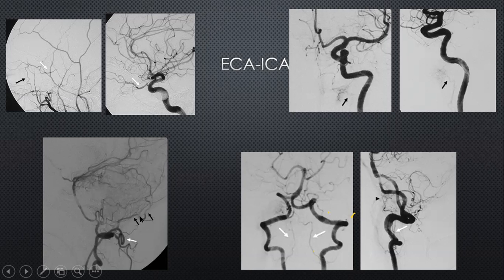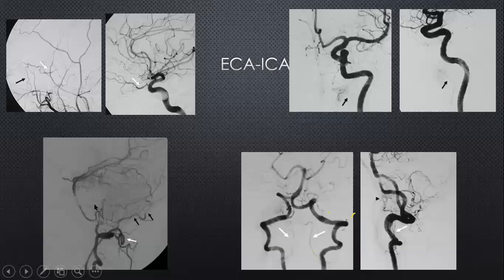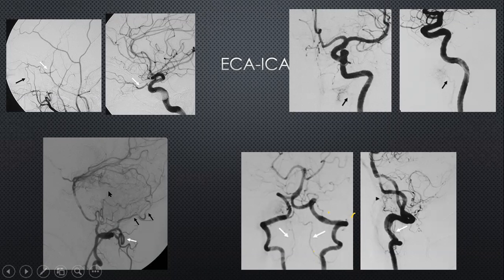But what we are seeing here is the occipital artery. So this is an anastomosis between the occipital artery and the vertebral artery, which is a very important anastomosis to understand, because sometimes if you are embolizing in the occipital artery territory, there is a potential that the embolic agent can extend into the PICA territory or into the vertebrobasilar circulation.